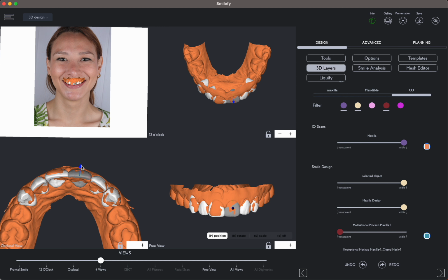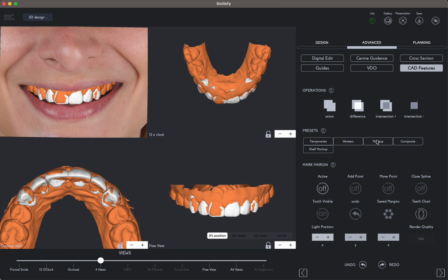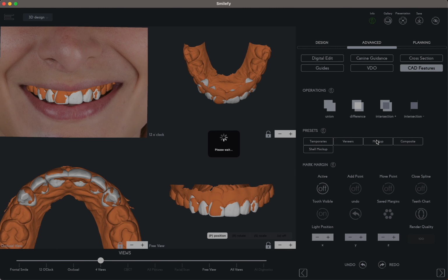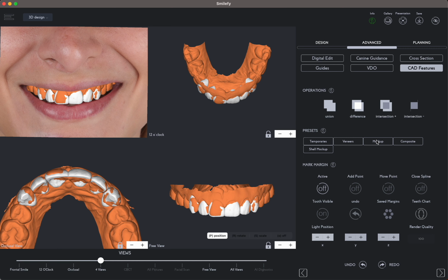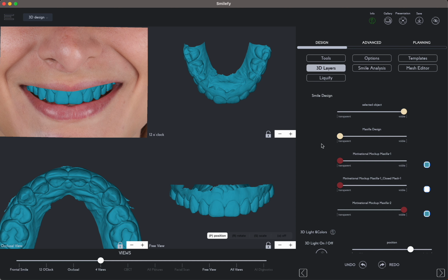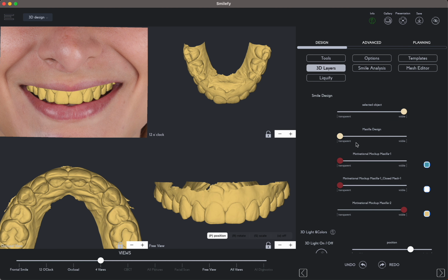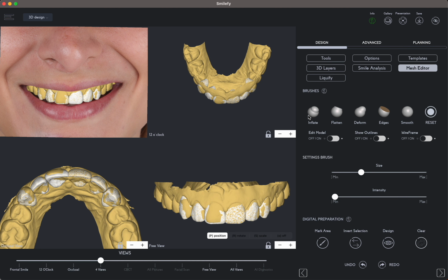The right central is in a wrong position. But because the patient does not want an orthocorrection, the tooth has to be prepped more aggressively, in order to restore the occlusal curve. That's the ideal pre-op design.